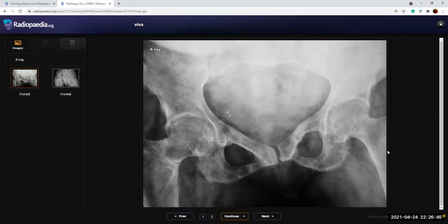So I think given that the patient is an elderly patient, the presence of multiple sclerotic lesions would raise the possibility of sclerotic metastasis, likely prostatic. Actually, that is not really sclerosis. It's just because of the projection and the way it is. Okay, so fine, don't bother about the sclerosis. So the presence of the insufficiency fracture in the right neck of femur.